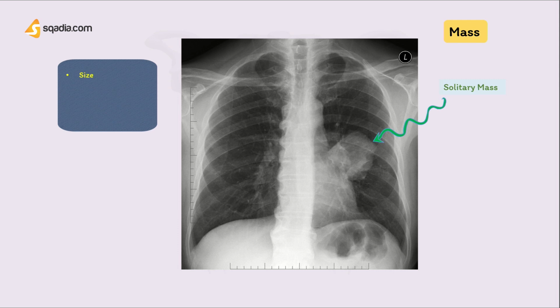The radiological factors to assess are the size, greater than 1 centimeter in diameter makes the lesion significant. The margins could be irregular, lobulated, or spiculated margins that suggest malignancy. Calcification would appear dense white like bones, but this is more rare in malignancies.